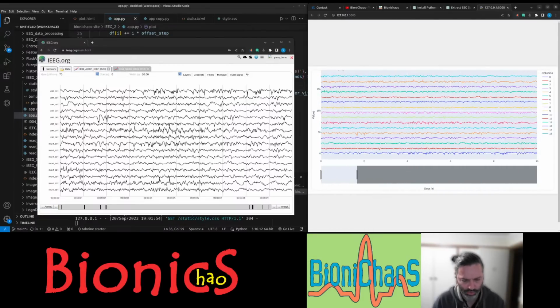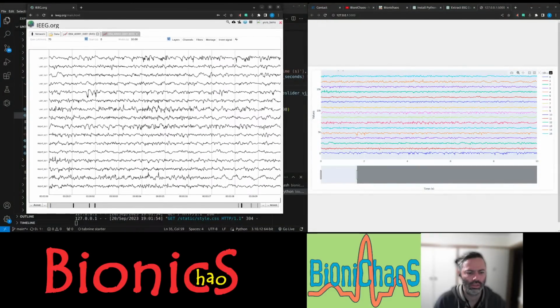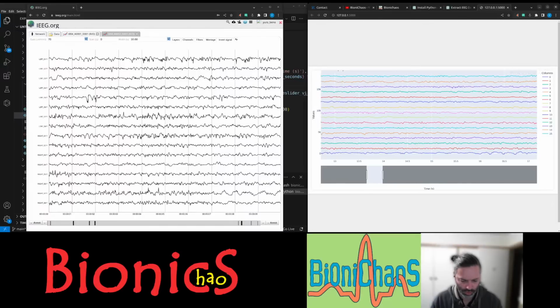And let me restart this. So why? Yeah, I want to be able to scale the whole thing.